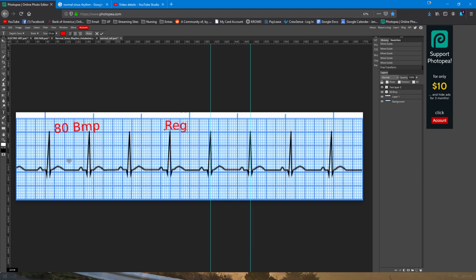That's important. Okay. So our PR interval should be around, I want to say, this one specifically is, if we zoom in a little bit, about 3 boxes, 4 or 5. It's a little wide. I mean, that could be a first-degree heart block, but for all intents and purposes in this one, it's not wide. So we'll just call it somewhere around 0.2, 0.16. We want it around there, but don't harp too hard on that until we get to heart blocks. Okay, so it's regular and normal.